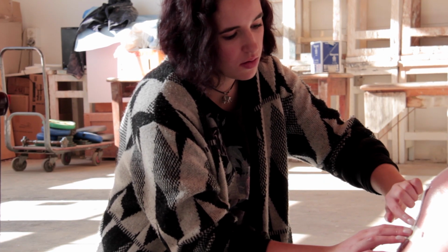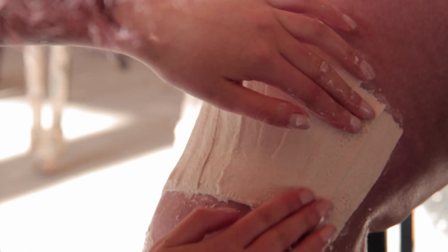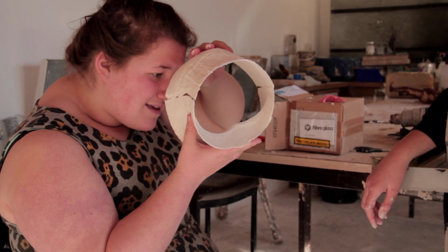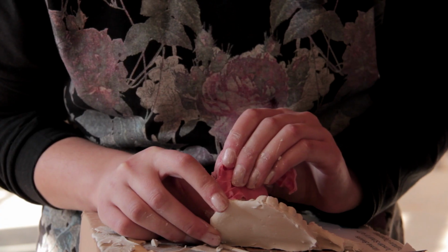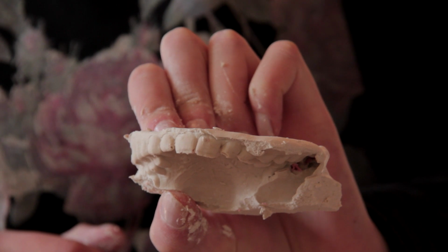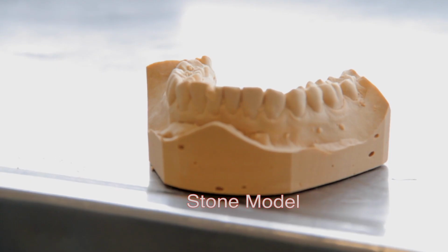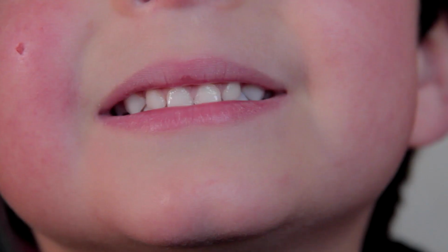In the creative process of art, students learn how to make different parts of the body. And to get the best results, sometimes they use similar materials to dentists to make their piece of art more real, like these teeth. This is called a stone model, and as you can see, it probably looks like your mouth.